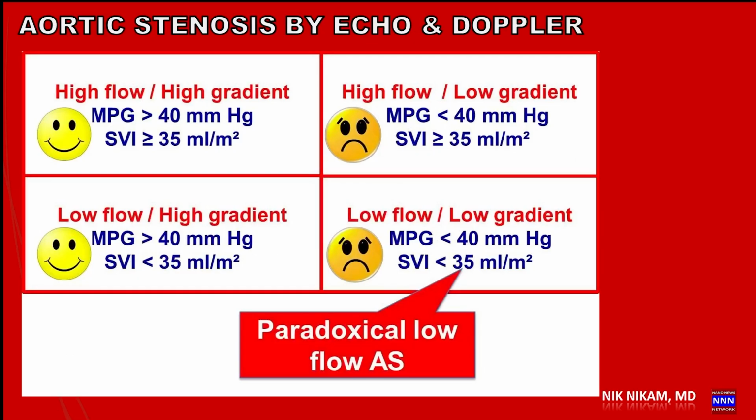What do we do with patients with aortic stenosis with a gradient which is like 35 and has a valve area which comes out to be 0.5 or 0.4? In those cases, we may be dealing with a pseudo-aortic stenosis, or it could be related to low output, low gradient aortic stenosis. The low output, low gradient true aortic stenosis would have a significant impact on the patient's outcome, which needs to be taken into consideration.